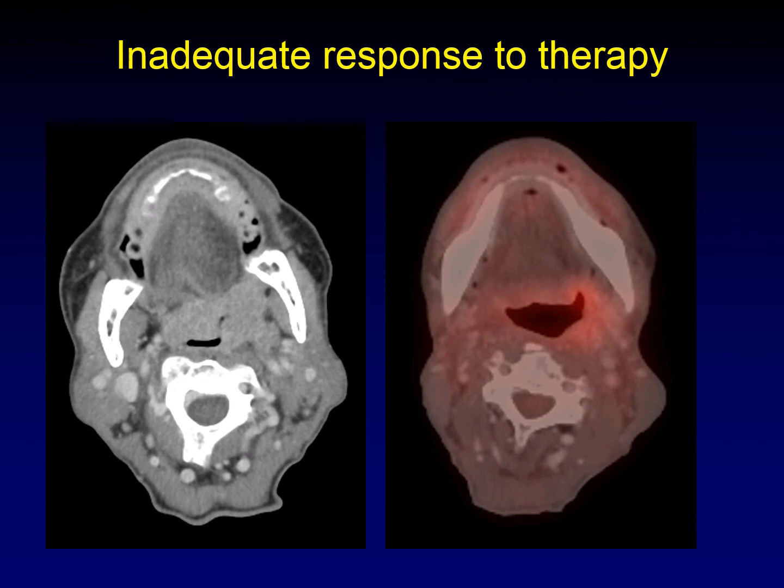Do be careful though, because mucosal disease, while it may not go entirely back to normal on PET, should become just a thin residual rim of enhancement on CT. If you can still see bulky enhancing tissue at the site of a large lesion, that's still worrisome, and this should be in your NIRADS-3 classification, or 2A if you want to get them just to look at it, 3 if you want to ensure that they biopsy it when they look at the mucosal surface.